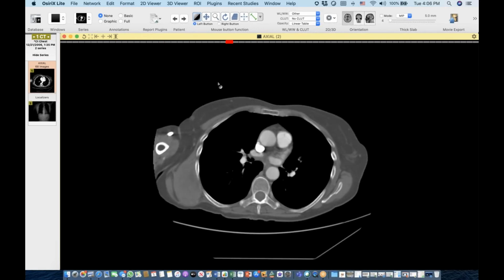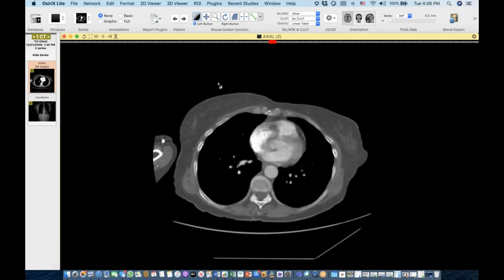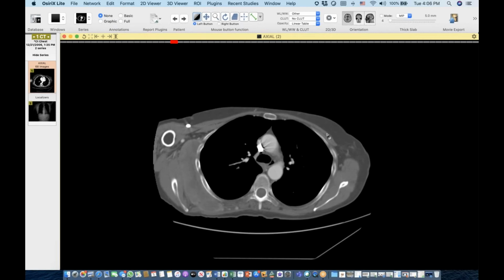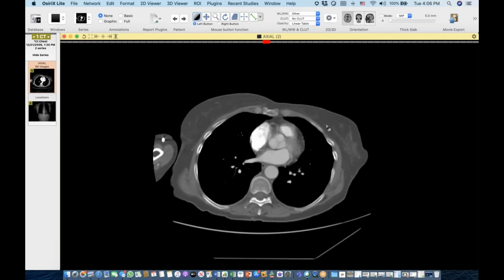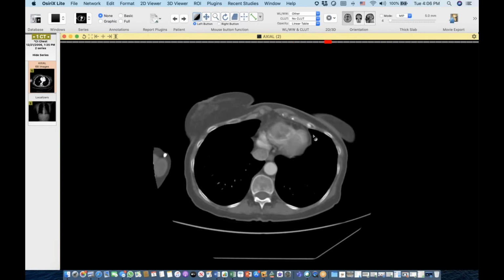It's missing the left pectoralis major, in keeping with Poland syndrome in part. They're very atrophic, but I think it's there. Okay. They're symmetrically atrophic, and again, it's a female patient, so you see the left breast is kind of hanging to the side more than the right, so that's why it gives that asymmetric appearance. That's a good thought.